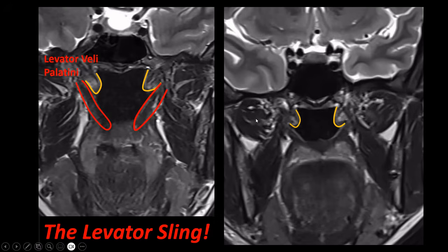This is another patient, just for practice purposes. We see the same things, the Torus Tubarius, and we see the Levator veli palatini attaching to the uvula and the aponeurosis of the soft palate. We see that there is tissue of the soft palate which has different signal characteristics. This is the non-muscular part of the soft palate. So the soft palate also contains submucosa with a lot of fatty tissue and some minor salivary glands and so on.